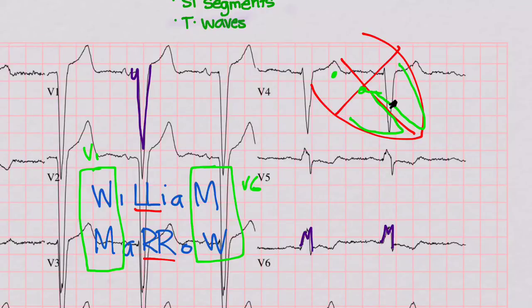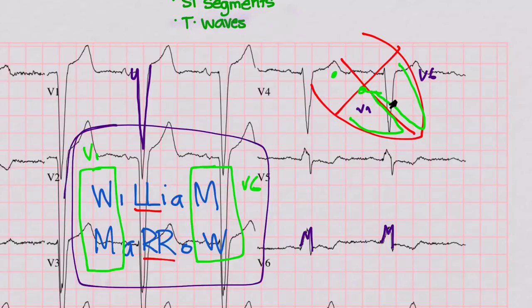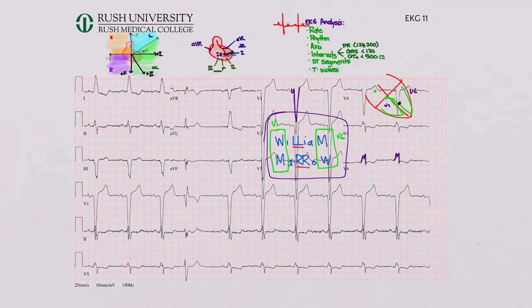If you want to get in more detail on this, there's a video on the QRS intervals that you can watch, and it'll show you why this actually happens. And it has to do with where the leads are, right? Because V1 is over here and V6 is over here. And if V1 is going fast and V6 is going slow, it looks like different things. But I think this mnemonic works pretty well. I use it rather than trying to memorize why everything is happening. It's good to know why it's happening, but there's that mnemonic. So let's zoom back out here.